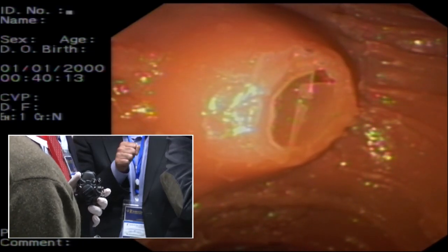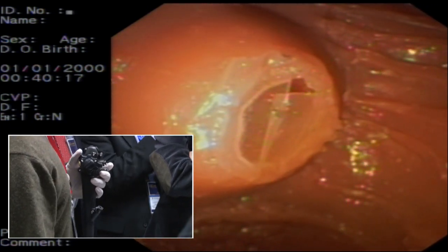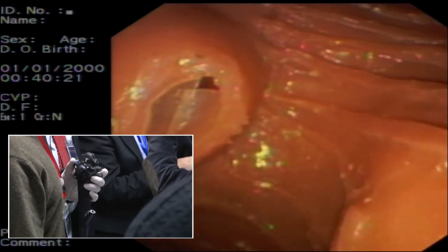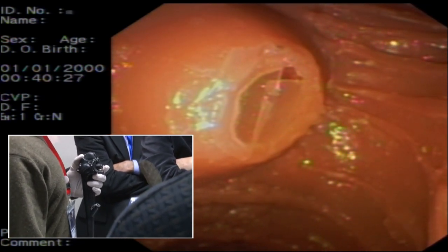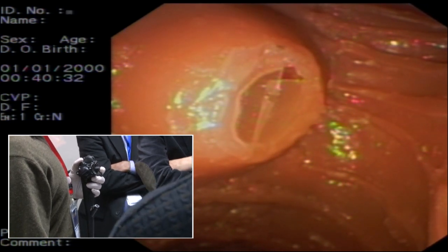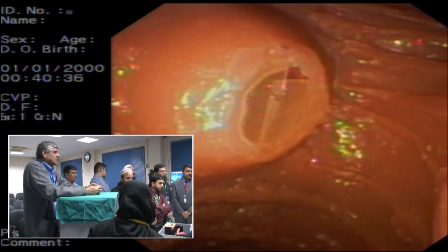That's not going to happen. So you have to either release the whole wrist and let it move with your shoulders, or just use the wrist. Because if you're relaxed here and you do this, you can literally see what your scope is doing. And that's a movement that's very useful. You can get subtle changes in that.